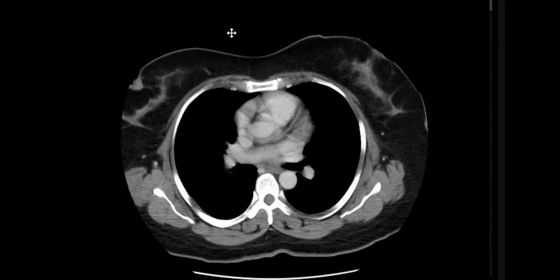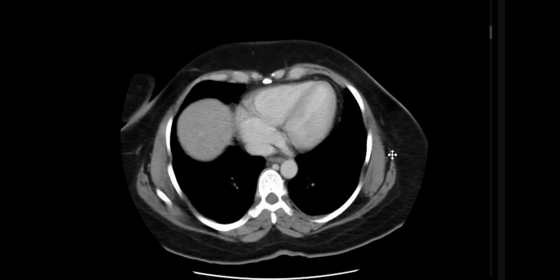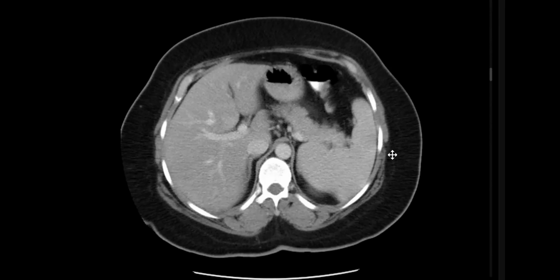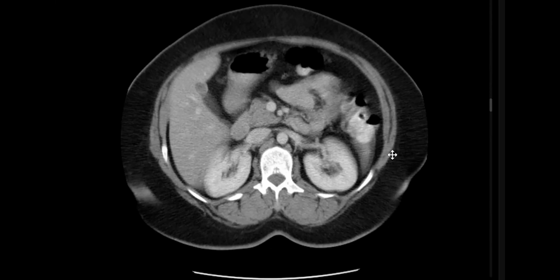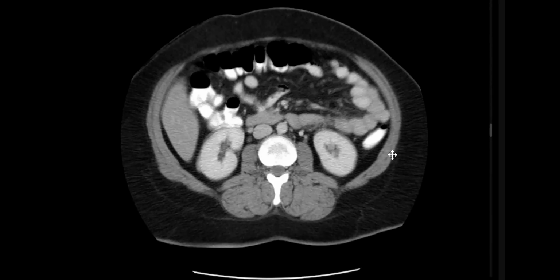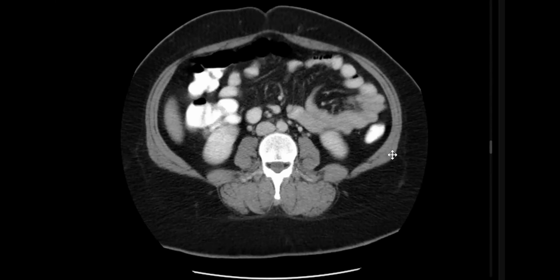Okay. I request control. You have it. Okay, thank you. Acute abdomen. I'm presented with a CT abdomen with contrast in the portovenous phase for a patient with an acute abdomen. I scroll through the study before I start commenting. I can see that there is motion artifact.